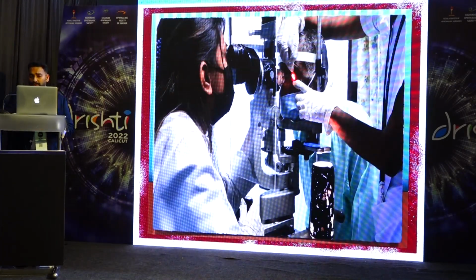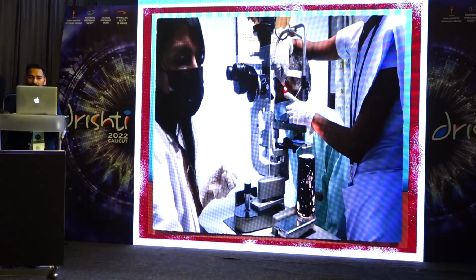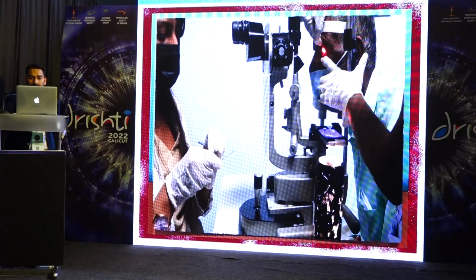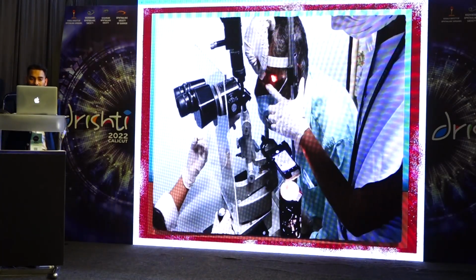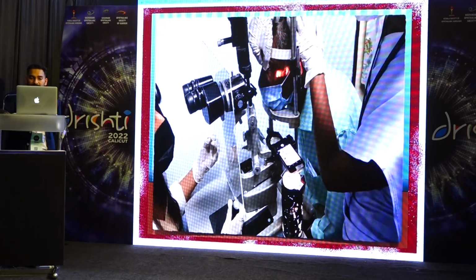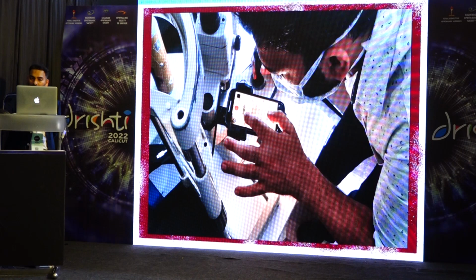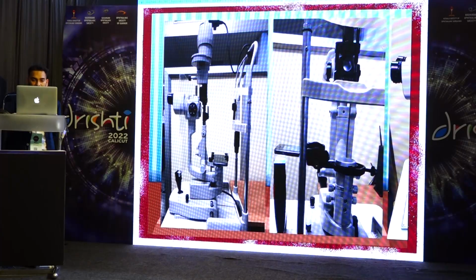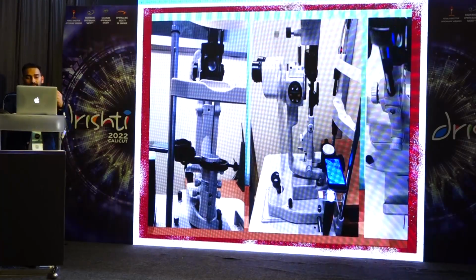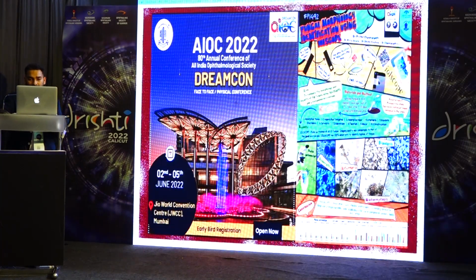You can use it to go around the whole field of the sample. Here is a demo showing the same, and then you can just check for fungal hyphae. Basically now we are doing it for fungal hyphae. The one for bacteria and viruses, we have not yet refined. Here you can see you don't have to remove the illumination part, you can just keep it on top.